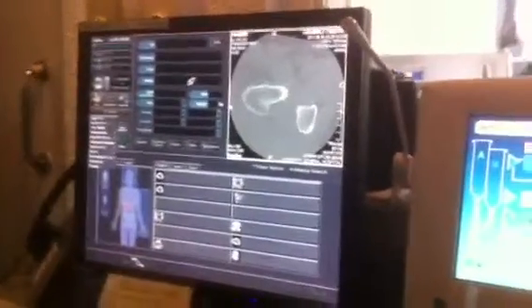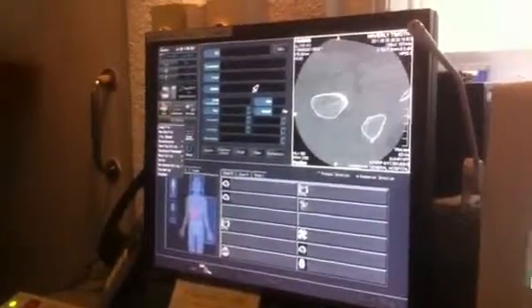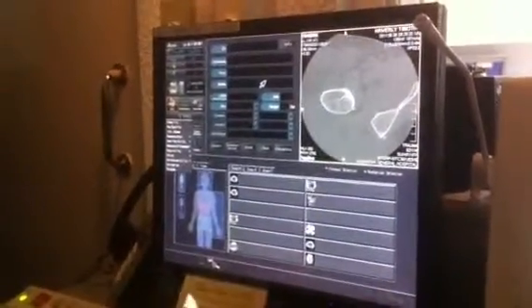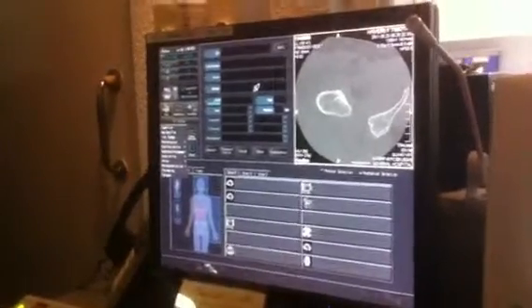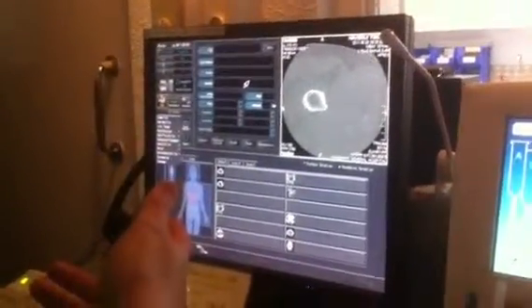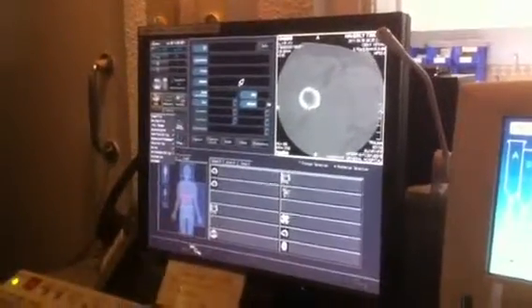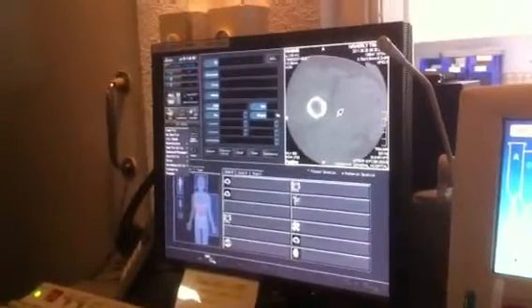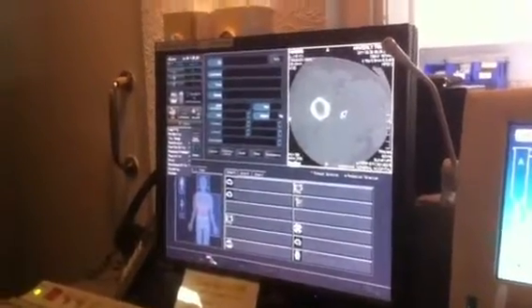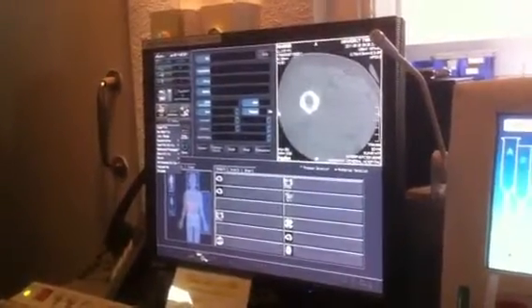Does that make sense? So this coming up is with the boost on, right? Once I'm sorry? You say once the order is split, then what did you say to do after that? Oh yeah, once you split it, you want to create some reference images. I'll show you again. And when we get done, maybe we'll sit Patty or somebody down and just see if they could do it. Or we'll stand around and coach him, then maybe he can tell us where we're wrong. So we get one of us to do it.